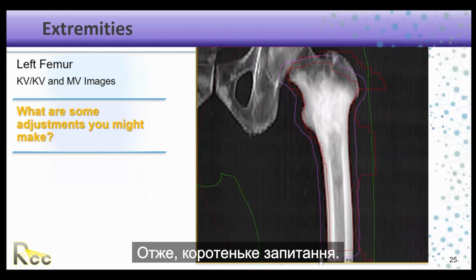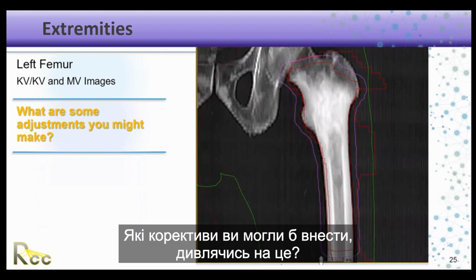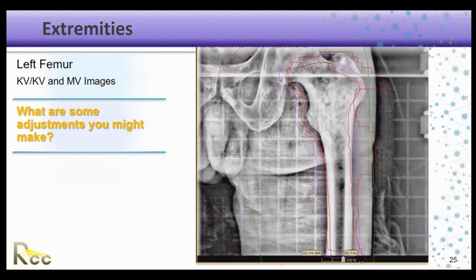So here's a quick question. What are some adjustments you might make looking at this?